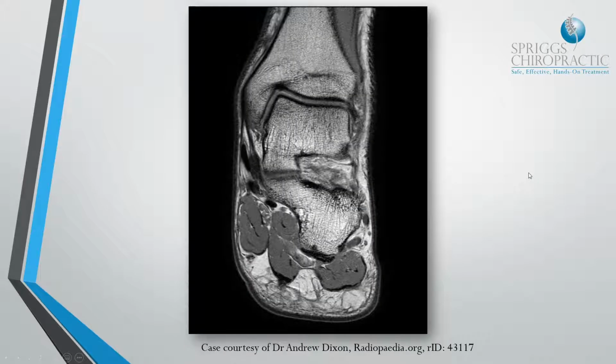There we go. So here it is on an MRI scan. Here's the dome of the talus, here is the medial malleolus, here is obviously the distal tibia. The fibula is not present in this particular projection, so the lateral malleolus is not present. That is because of the positioning of the two bony structures themselves. They are not necessarily directly in a coronal plane. They are not directly opposite each other, so you will not necessarily see them together on an MRI.